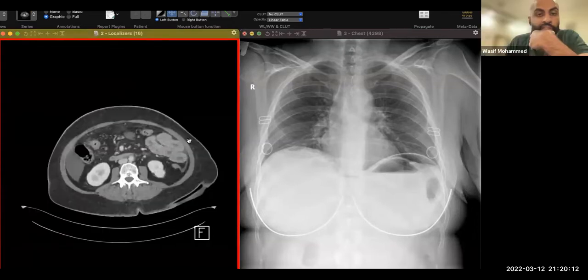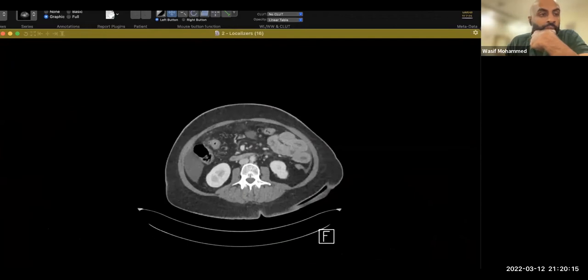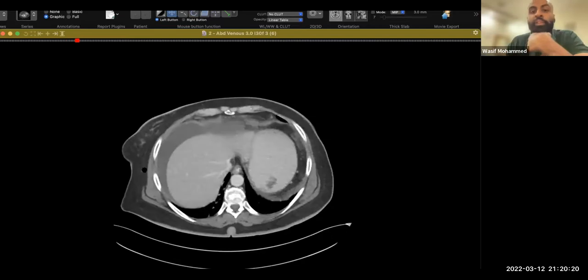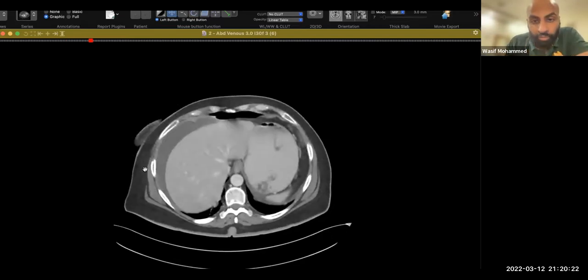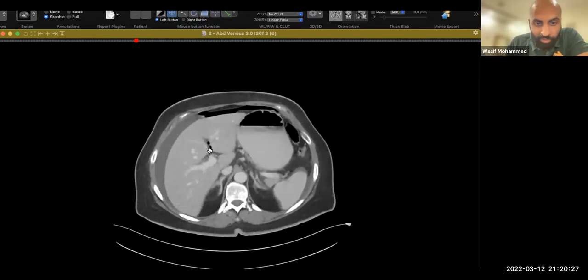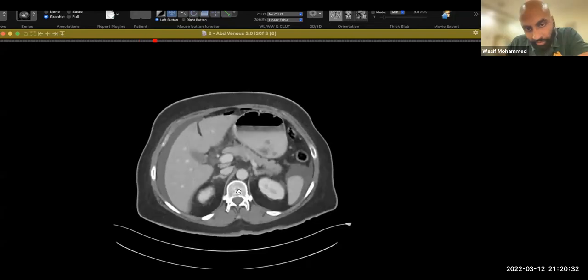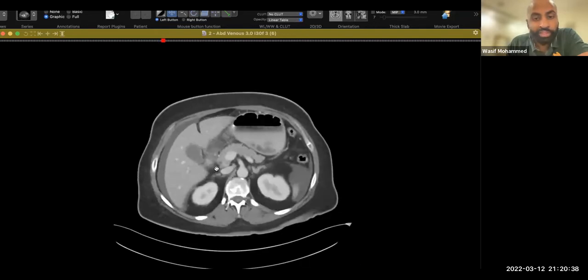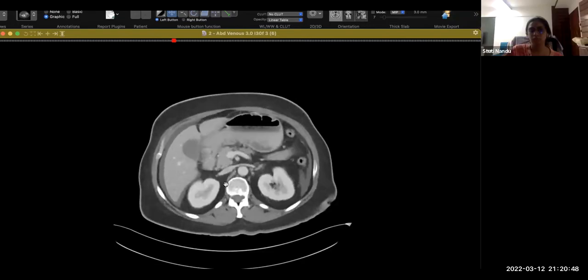On the CT itself, you look at the way the pneumoperitoneum is distributed to suggest what could be perforated. Over here you have these gas bubbles tracking through the liver lobes, and you can almost trace them to the duodenum here, and comment if there is any alteration in the appearance of the walls of the duodenum or the stomach, for that matter, some thickening or some adjacent fat stranding.